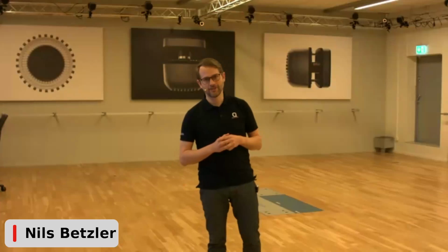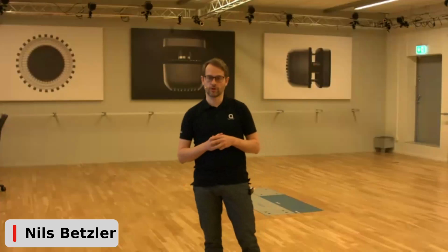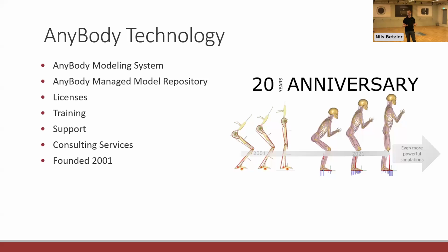Now, I'm happy to hand over and introduce Søren Tørholm, who is Head of Services at AnyBody. Søren will give you an introduction of the AnyBody modeling system and what its capabilities are. Søren's job at AnyBody is, like the team from AnyBody explained to me, to bring the models to life. So he's in charge of finding the right solution for any customer questions or requirements that require modeling on the AnyBody side. So Søren, great that you're joining us today. And I can see your screen is up. So over to you.